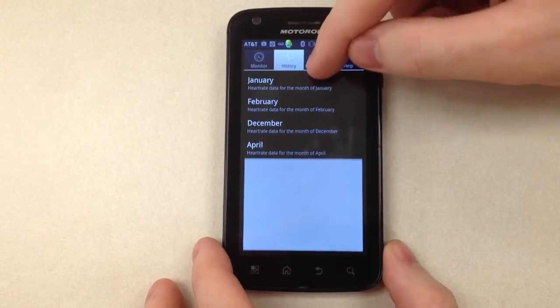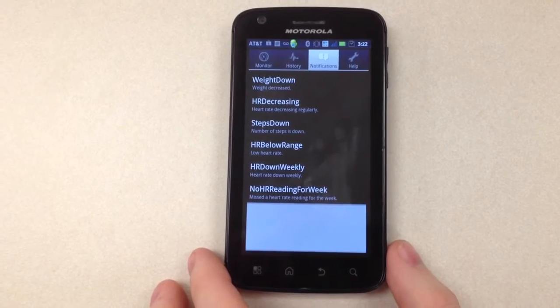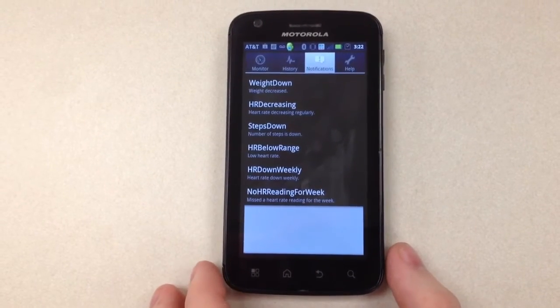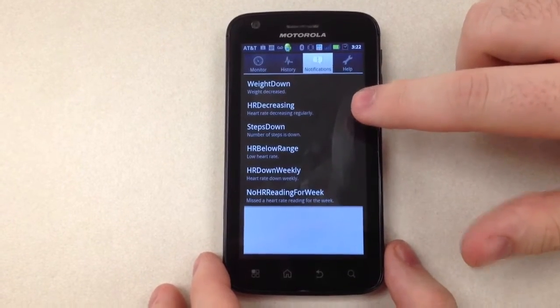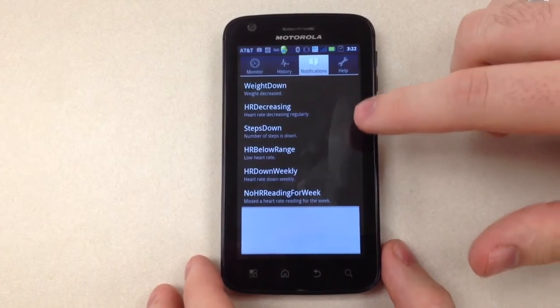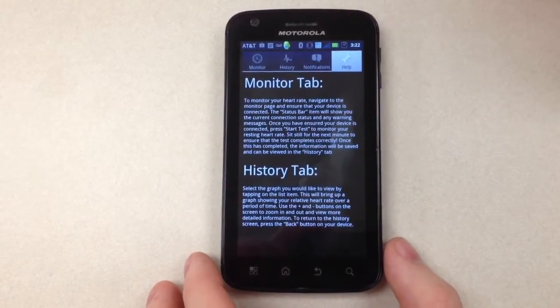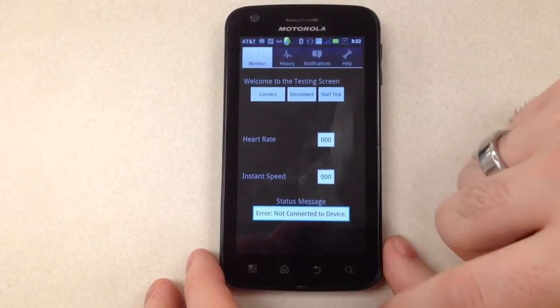One thing we've also added is a notification screen, so we've taken more data than just data from our heart rate monitor. This semester we've added in a new device. It's called the Fitbit. We'll talk about it a little bit later. And this allows us to basically take different pieces of data that we read and show users notifications based off of that. So we take the data and we do number crunching and calculate trends for the user and show them notifications for that here. We, again, like we did before, also have this help tab. So this is currently in the doctor monitor application.